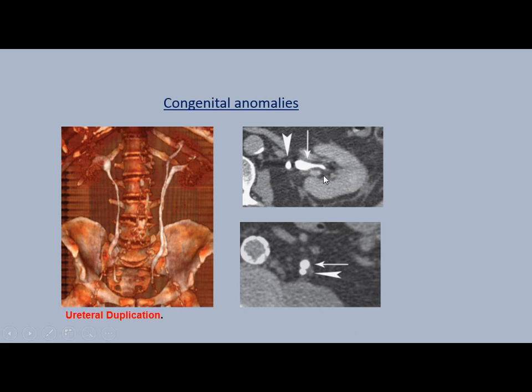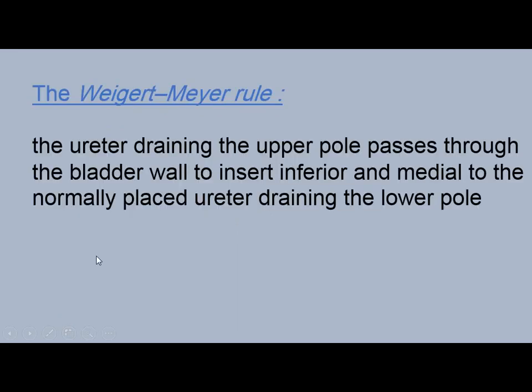This image at the level of the lower pole of the kidney points to the lower pelvis, while this one, which is opacified and filled with contrast, is the upper ureter. So this is a complete duplication, and as we follow the images at levels below, we see both ureters, which are twisted or somewhat parallel together, down to the pelvis.